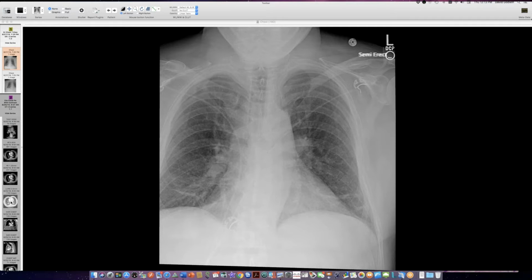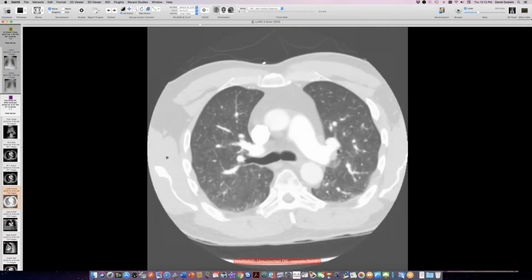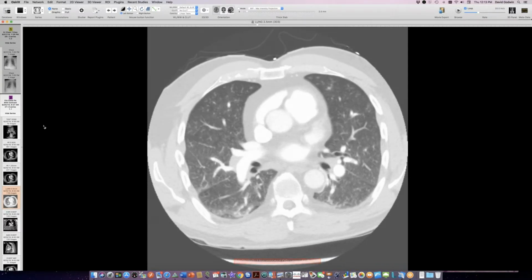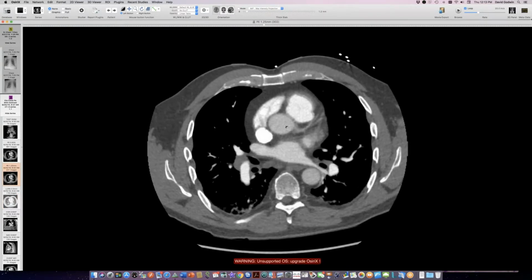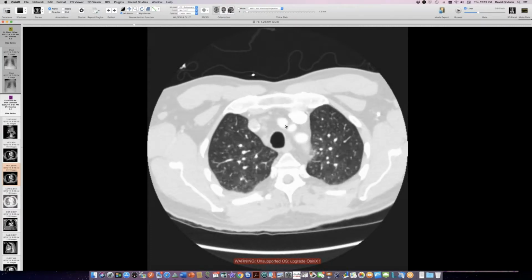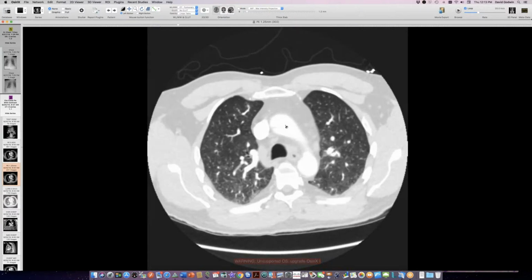And he had a CT scan around this time, and it does show that he's got these very small little lung nodules. Let me show you finer slices here to help bring this out. And you will agree, I think, that he has tiny little central lobular dots everywhere. Yep.